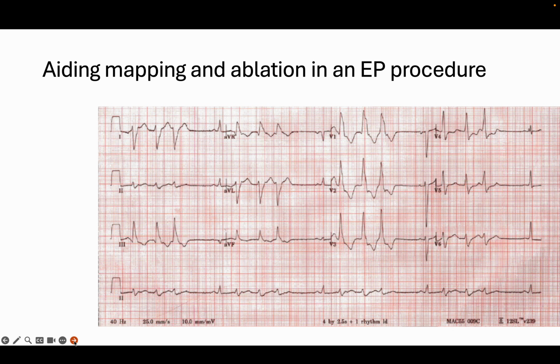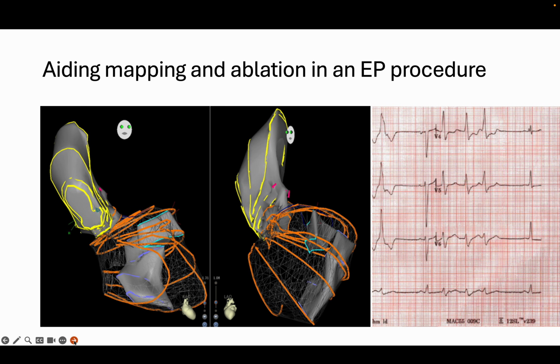Very rarely, or more commonly these days but limited by our financial abilities, is the ability to trace the endocardial border using intracardiac echo, represent it on an electroanatomical system, and thereby create ventricular maps of intracardiac structures in order to assess for contact. This is a special program that allows us to visualize these separately from the ventricular chamber itself, and therefore we are able to map them well.